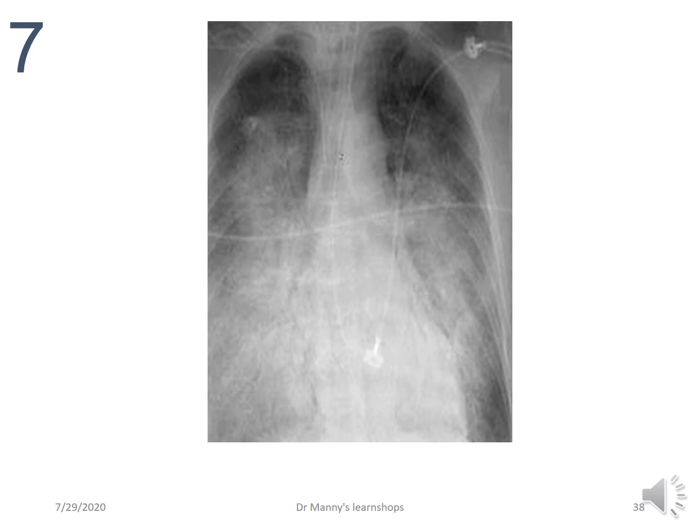Well, this is a pretty sick looking chest X-ray. You've got middle lobe and lower lobe involvement and upper lobe involvement throughout the whole X-ray. You've got an air bronchogram effect. It's possibly underpenetrated as well. But if I said to you here that this patient is really, really unwell, then you might come up with an interpretation that could indicate probable acute respiratory distress syndrome. But the history and the physical assessment and the laboratory results are really important as well.